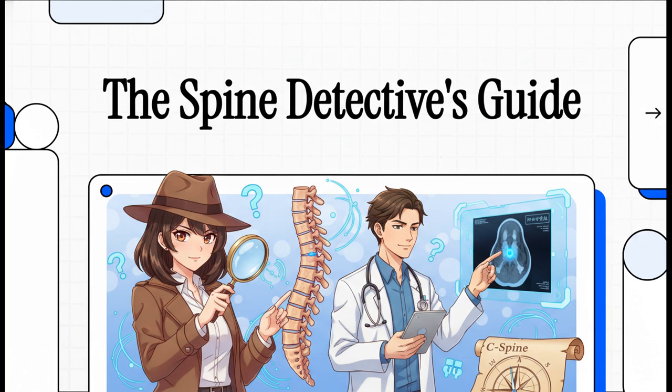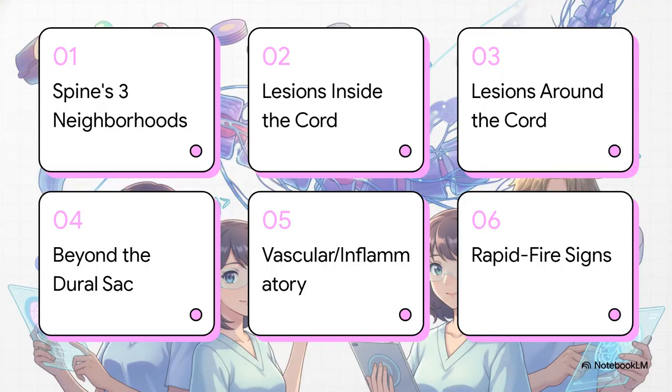Location. I'm telling you, if you can figure out where it is, you are well on your way to figuring out what it is. So here's our game plan. First, we'll map out the 3 main neighborhoods of the spine. Simple. Then, we'll look at the usual suspects you find inside the cord, then around it, and then even outside its main protective layer. We're also going to expose some imposters, things that look like tumors but aren't, and we'll wrap it all up with a rapid-fire round of classic radiological signs.